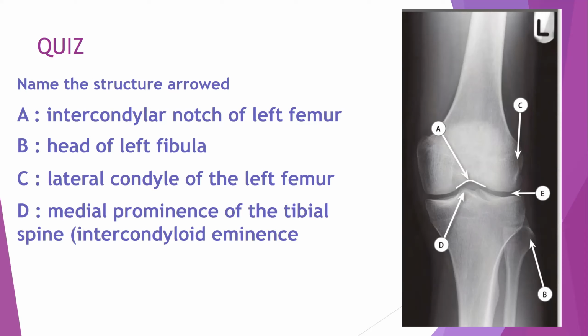This is the joint space of the left knee joint. Excellent.